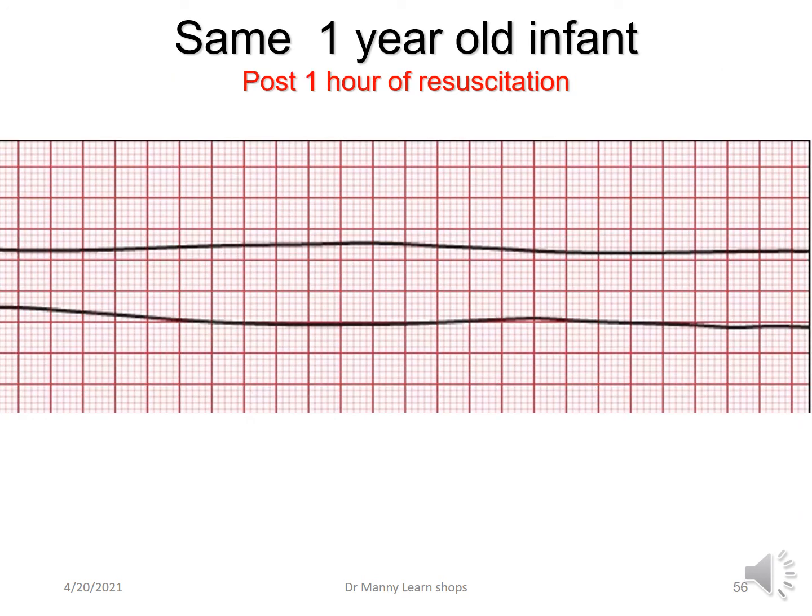The same 1-year-old infant was resuscitated for more than an hour, defibrillated, given medications, and then they went into this rhythm. And the doctor decided to end resuscitation after consultation with the parents. And this rhythm is asystole. No electrical activity.